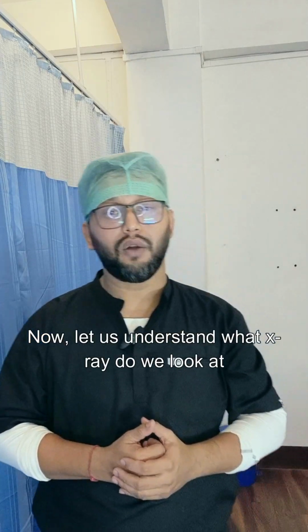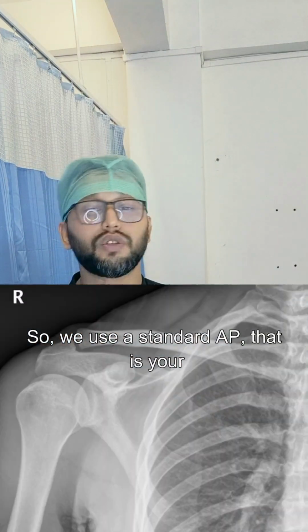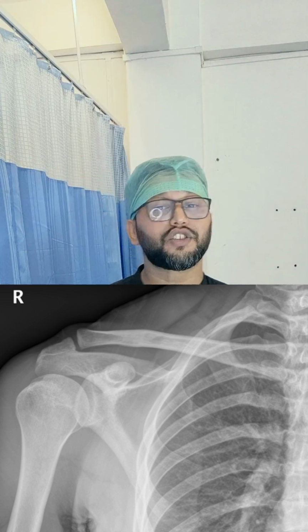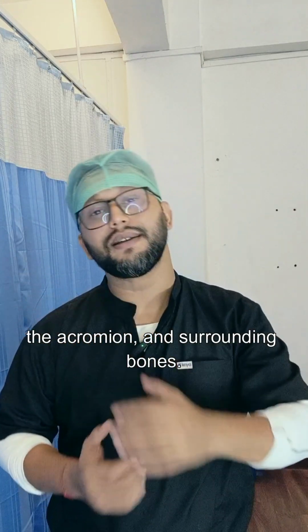Now let us understand which X-ray we look at in this kind of circumstance. We use a standard AP, that is anterior posterior, view of the shoulder. This view shows us the position of the humeral head, the glenoid cavity, the clavicle, the acromion and surrounding bones.